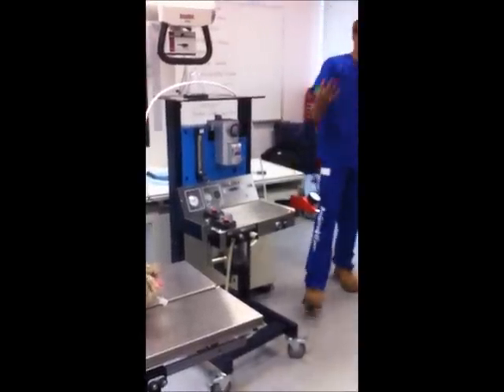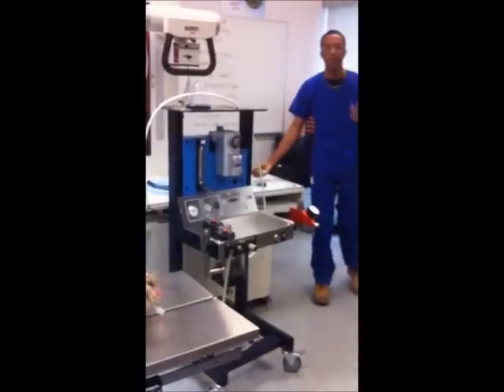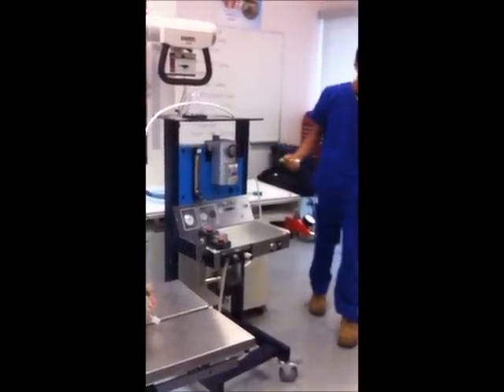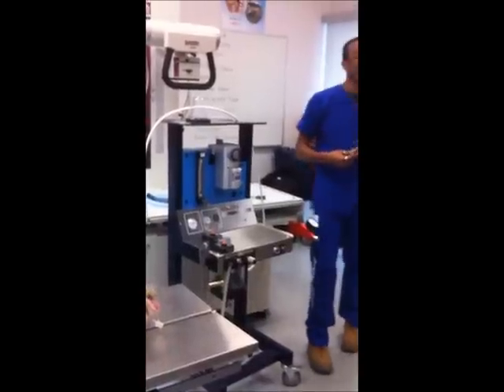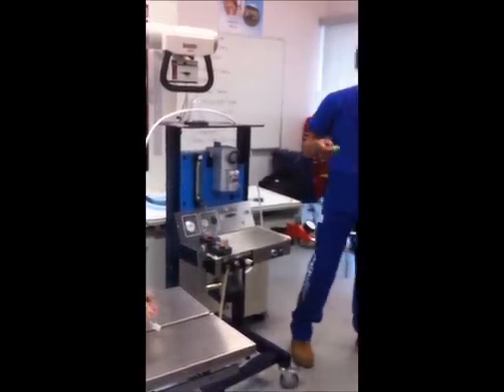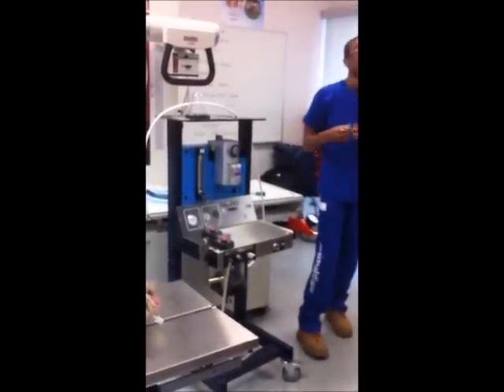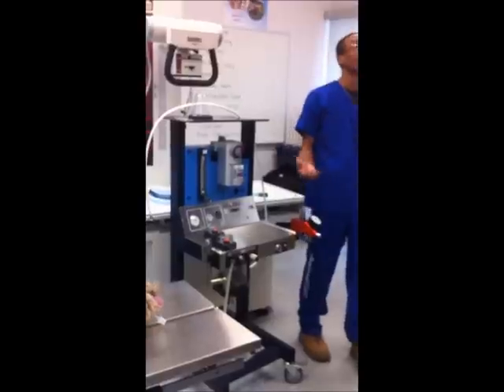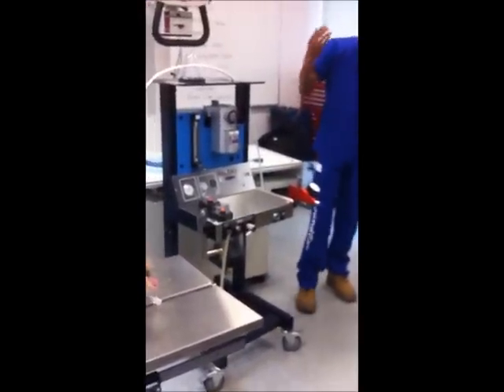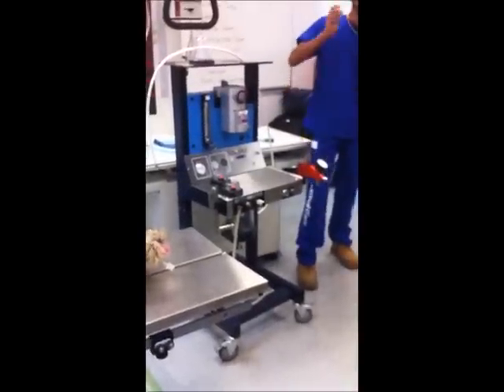And how is this weight specified? What weight is used for the non-rebreathing system? What weight is used for the rebreathing system? The kilograms? Isn't it over 10? No, it's over 8. Over 8 kilograms is the rebreathing system. Under 8 kilograms is the non-rebreathing system. Some people came up and asked, what if the animal weighs 8 kilograms? So we specified it for you guys. 8 kilograms and more is the rebreathing system.